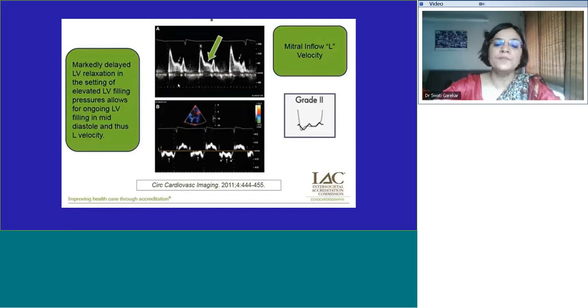are confusing, and many of the times in our pediatric side we see a lot of EA fusion, just a single wave. So is that what this is? Absolutely not. That fusion might be normal or is normal. What I'm talking about is something totally different. I'm talking about in the period of diastasis when you have two separate peaks, E peak and an A peak, and in between you have some flow happening denoted by some velocity of blood captured in your spectral Doppler tracing. So that denotes diastolic dysfunction.